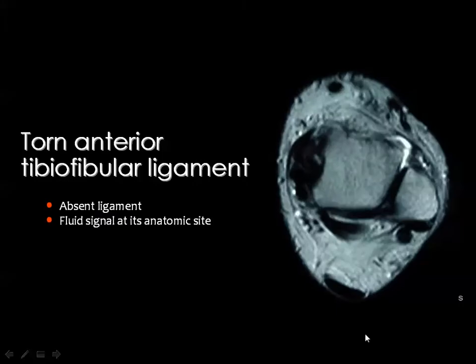Then the anterior tibiofibular ligament is commonly injured, and injury means that you do not see the ligament and its site is replaced by fluid.